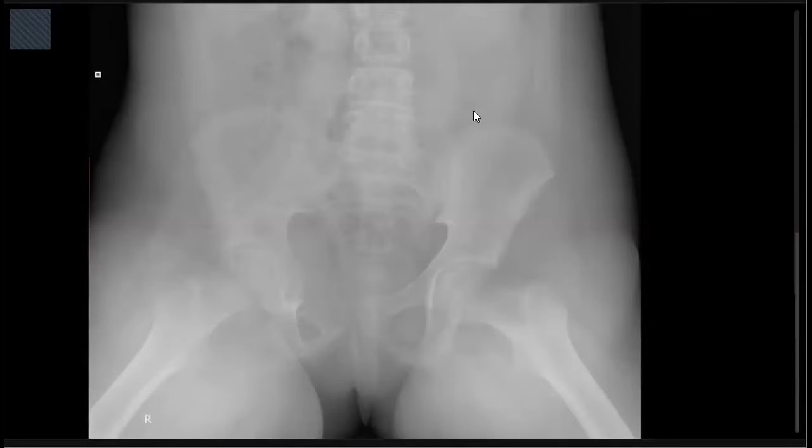Normally I will adjust whatever is possible to look for any fractures. I have a suspicion of bilateral changes. The epiphysis head is a little smaller, and it is bilateral and sclerosed. I think I would go with bilateral Perthes disease, because of this sclerosis. However, I think if I carefully draw the line... Anything else? Ignore the femoral heads.